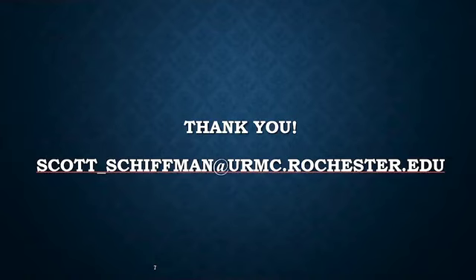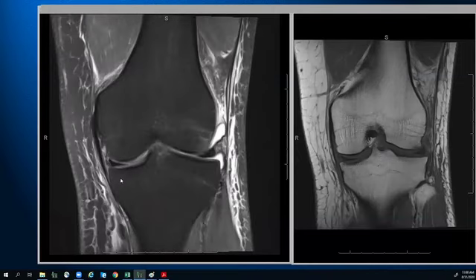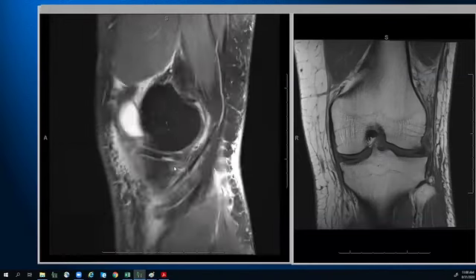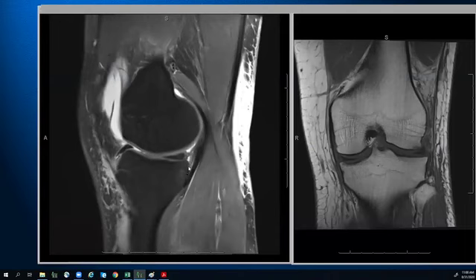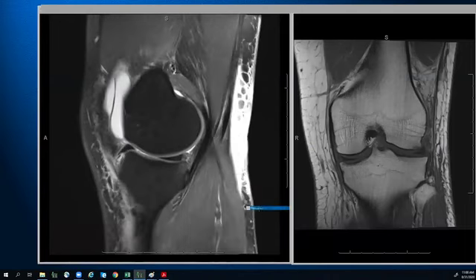Hopefully, I will show that case again where I made an allusion to that phenomenon. Here's the case that I was calling a meniscocapsular separation. Now pretend that there was a tiny dark fragment associated with this portion of the capsule. Then you'd be hard pressed to say, this could be a very far peripheral vertical tear where you have the thinnest sliver of meniscal material still attached to the capsule.